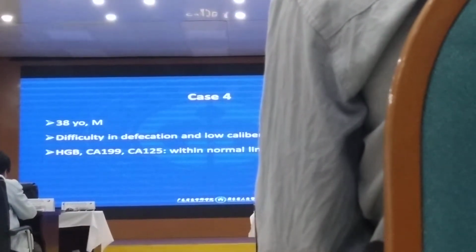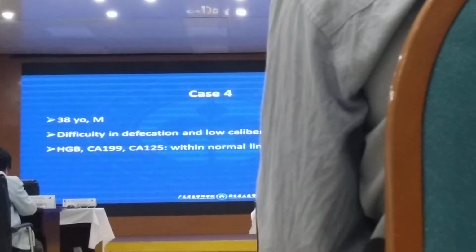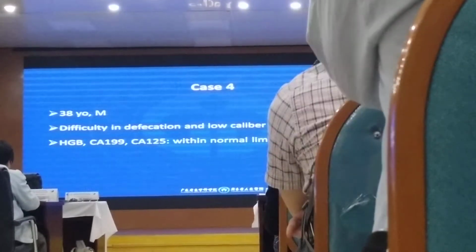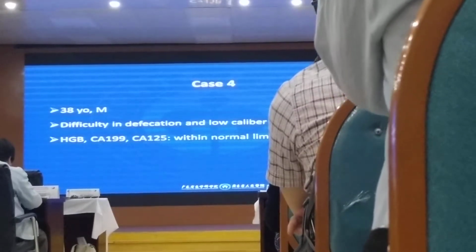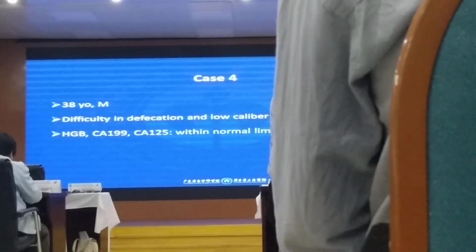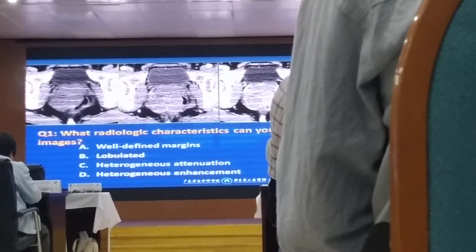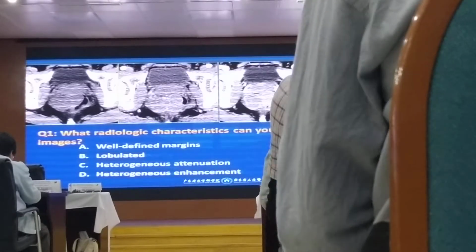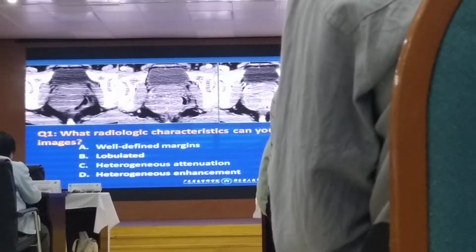Case 4 is a 38-year-old man who had difficulty in defecation and low caliber stool for half a year. Biomarker tests were normal. Question 1. What radiologic characteristics can you identify from these images?